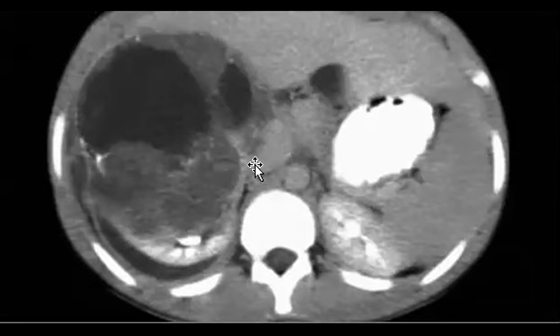This is the differential, which could be with this cystic appearance. When you find subcapsular fluid collections, and they mention tumor lobules, there are more necrotic areas, and sometimes maybe you can find hemorrhage.